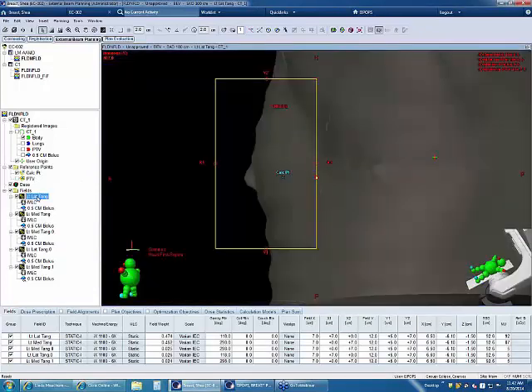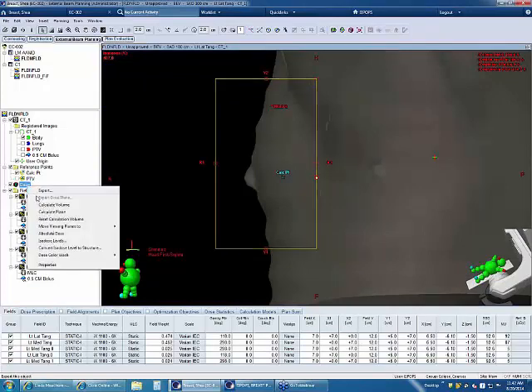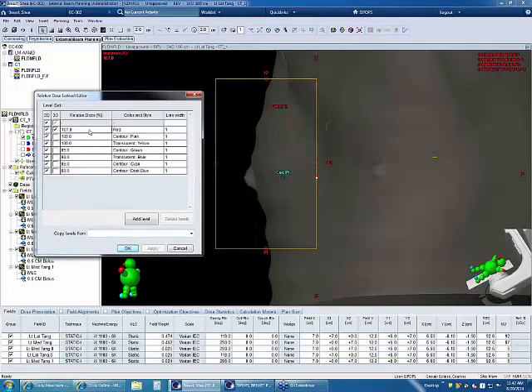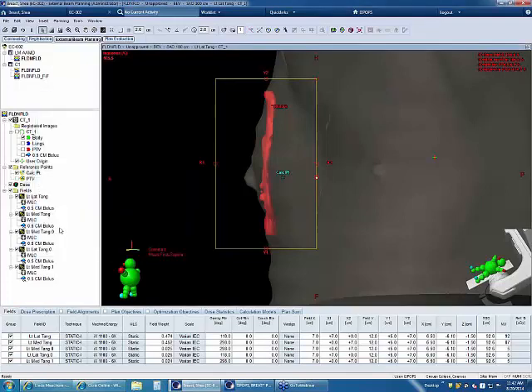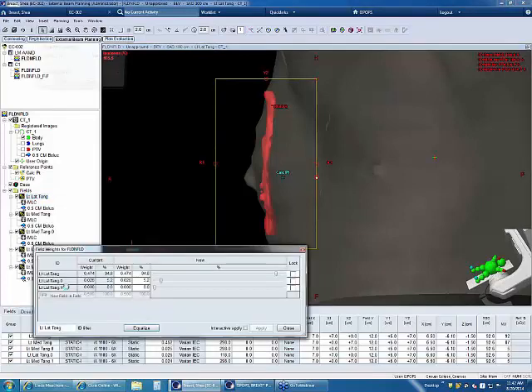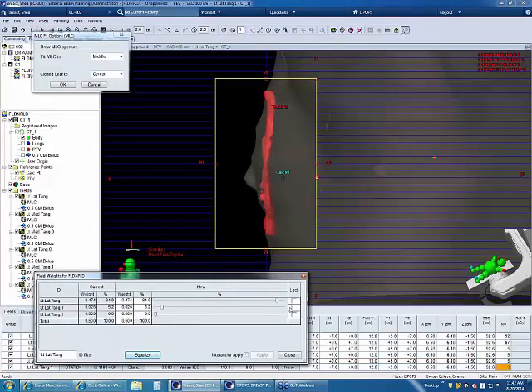I'll do another left lateral then. And we come up to the isodose levels. Let's try something like 105.5. See what that gives me. Yeah, that's pretty awesome. Yeah, I think I'll try that. I'll say OK. Now in the 10, we get a new field in field. Okay. All right. And again, the first thing I do is lock that first subfield.